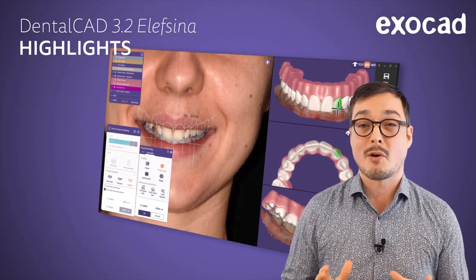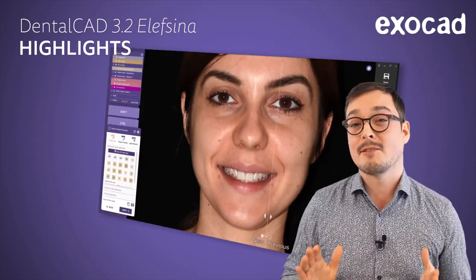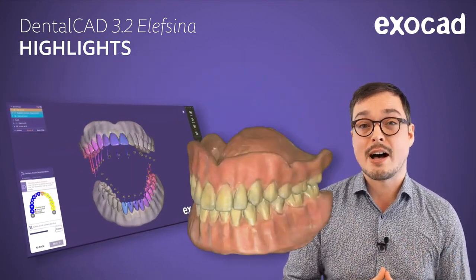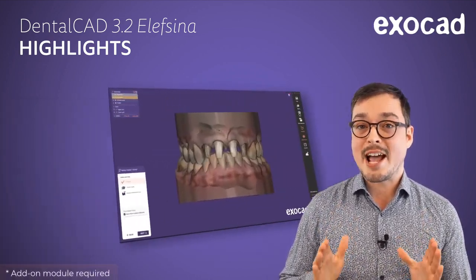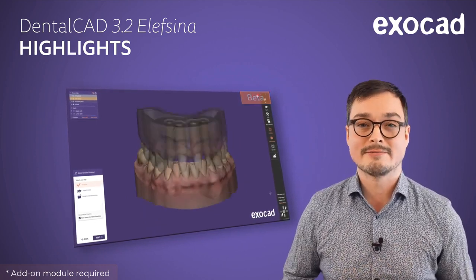You will love our elevated smile creator, which provides better visualization based on patients' natural teeth. Our new copy denture workflow segments all teeth and the gingiva from the scan data, so you can recreate a new set in no time. You're also able to export colored models with the optimized parameter for multicolor printing.